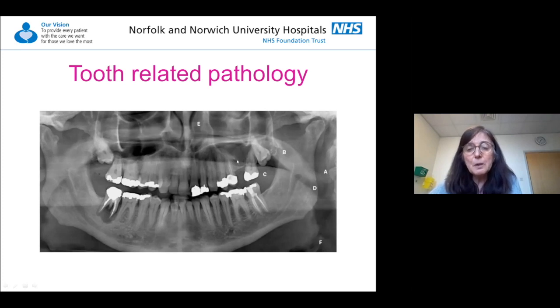You can see the antrum dipping down very close to this second molar tooth, and the shadow of what might be an antral polyp. Now, there may be a deep periodontal pocket going from the mesial aspect of that tooth and causing this inflammatory response in the maxillary antrum, it's difficult to know, but they're all things that we can see on an OPT radiograph.